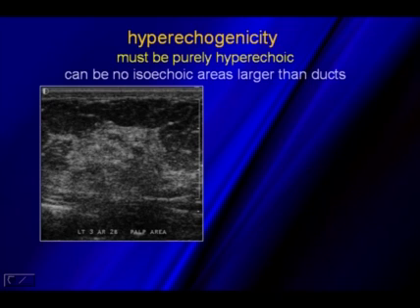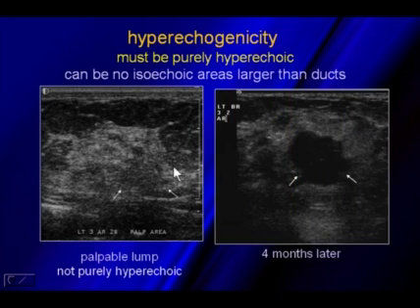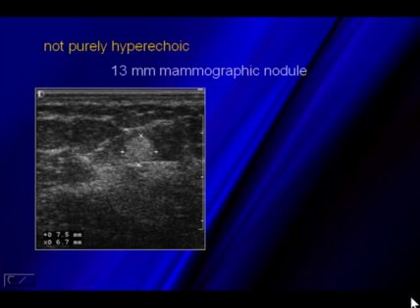Well, the patient came back to our department 4 months later, and we can see kind of within this gray area here, which nobody could really make out a mass at the time, this high-grade invasive ductal carcinoma kind of exploded that she had not felt previously. So these high-grade lesions are very rapidly growing. Very important that if somebody's going to follow up what you think is normal tissue, that they check that area at least once a month.